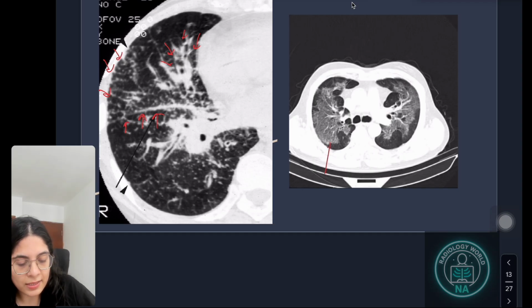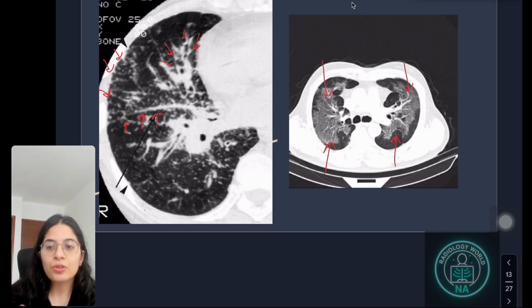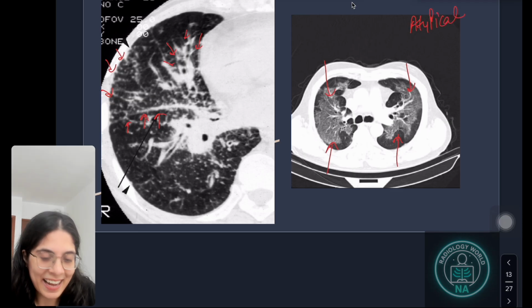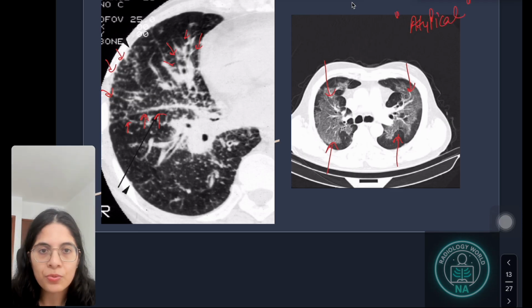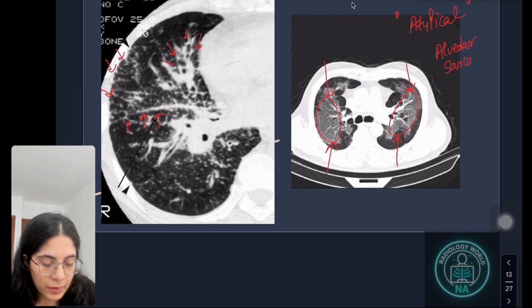In this particular HRCT image, you can see that there is diffuse ground glassing. So this is something which is atypical sarcoidosis. This is a little higher level. They usually will not test you on NEET PG, but if you are giving some higher level examinations, they can test you on this atypical sarcoidosis. You can see that here the entire lung parenchymal space is involved. So this is a case of alveolar sarcoidosis.